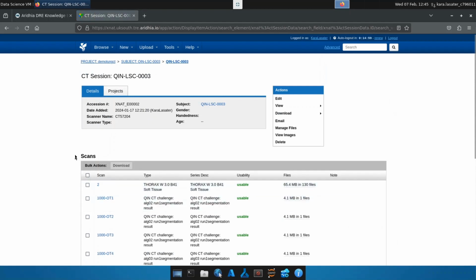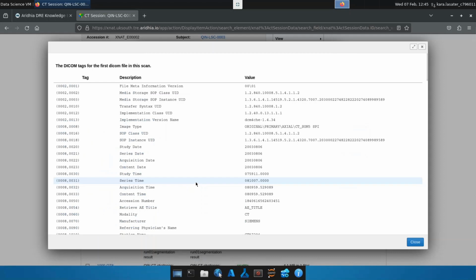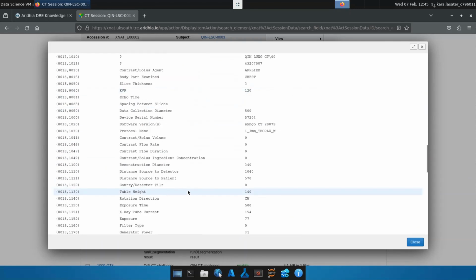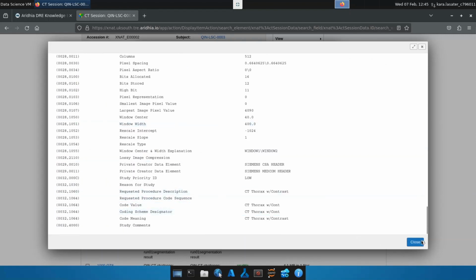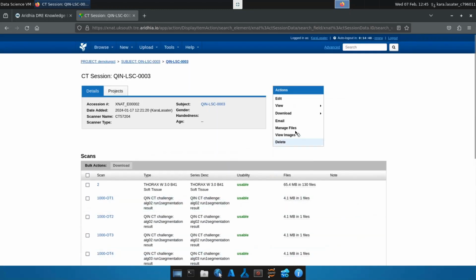On XNAT, researchers can search across all available datasets, imaging types, or patients. Datasets are arranged in a hierarchy of projects, where researchers can view metadata, preview images, and access relevant information such as patient demographics, imaging protocols, and annotations. Researchers can search for specific imaging studies, filter by metadata, and generate reports on image and clinical data.